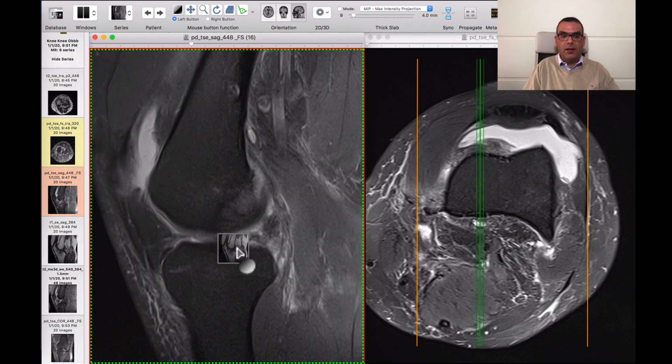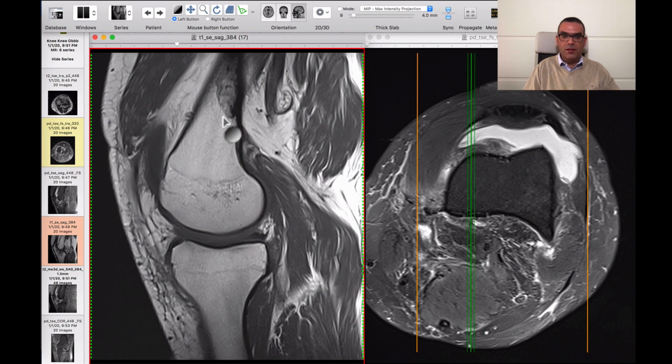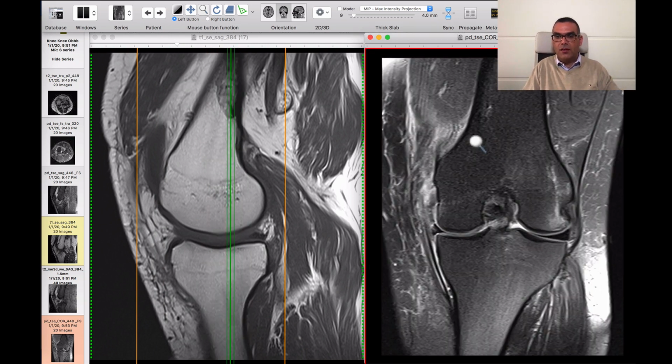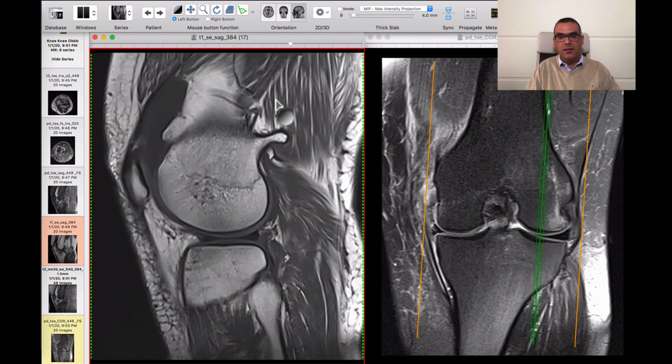This is an osteochondroma. And as we saw in the T1, of course, there is just a heterogeneous area of subchondral sclerotic marrow lesion, and this is mostly a healed non-ossifying fibroma. So this is an incidental finding. There is a healed non-ossifying fibroma at the distal femur, and there is an osteochondroma as well. So this is a case full of pathology.